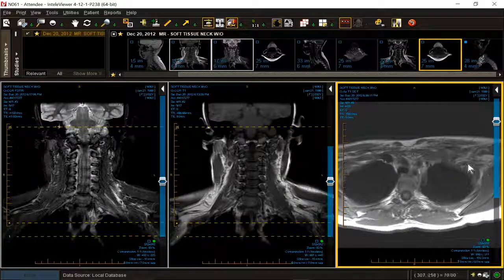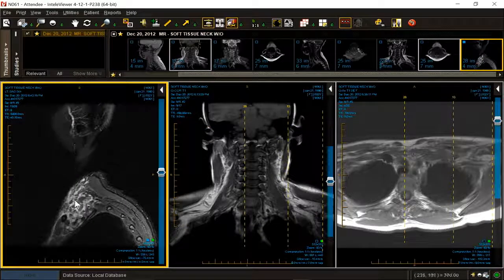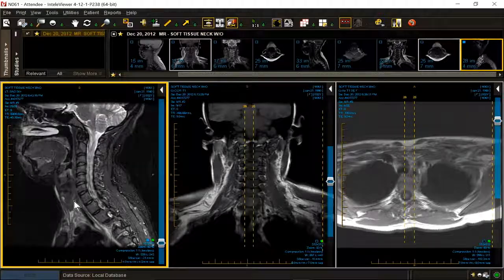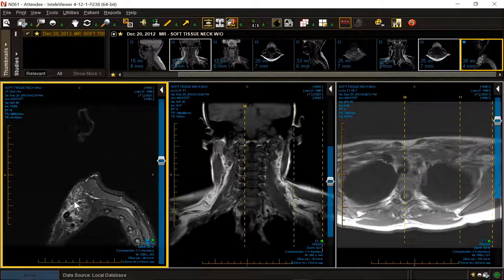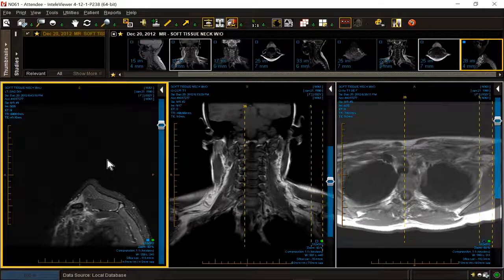The arm is swollen. We can see that directly on the T1 MR. We can see it directly on the sagittal MR, swelling in the supraclavicular region. That swelling persisted towards the midline and peripherally into the axillary space. Let's try and sort out some of the key anatomic structures in the sagittal projection.